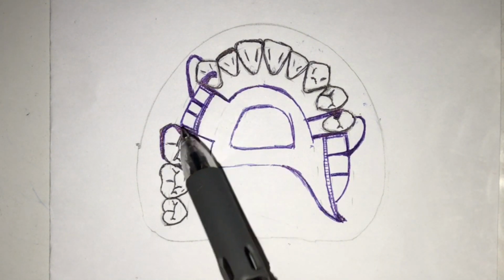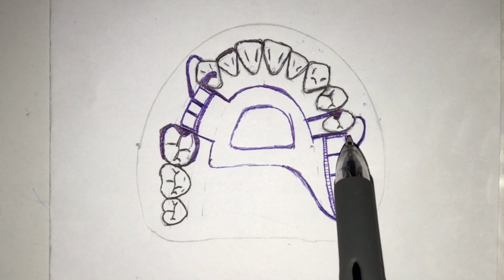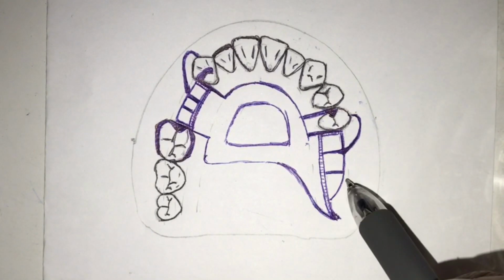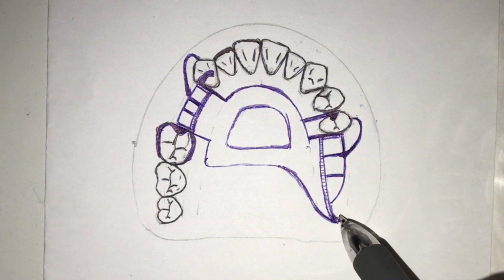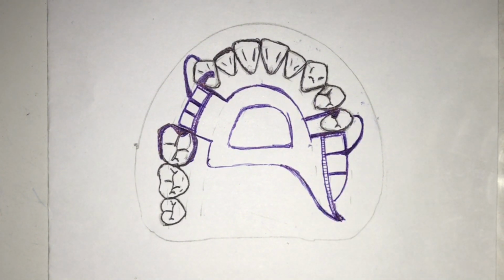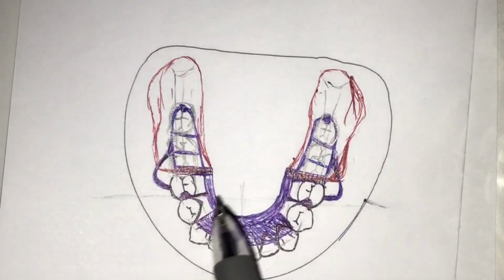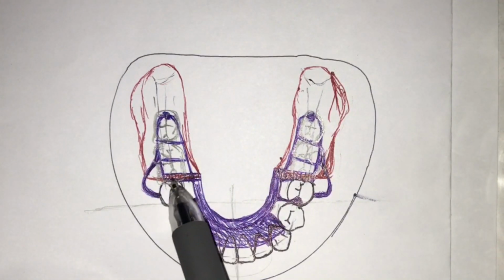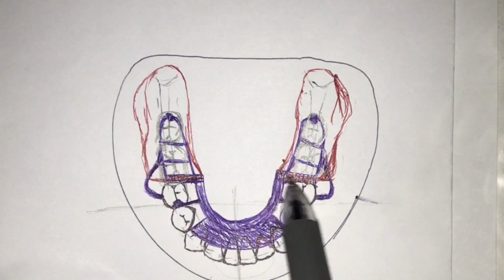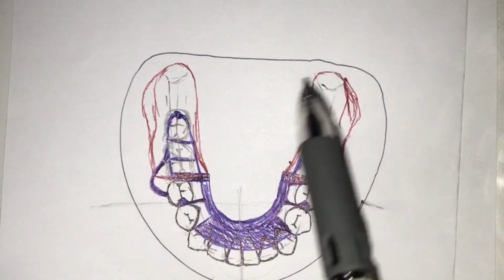Your gridworks are again lattice, and here I opted to end a little bit more than 2/3 of the way. That's okay. You can also opt to go all the way, that's just fine as well, or just really 2/3. And compared to your mandibular, the finish line on your mandibular is just located adjacent to the last abutment tooth for a free or distal extension case.